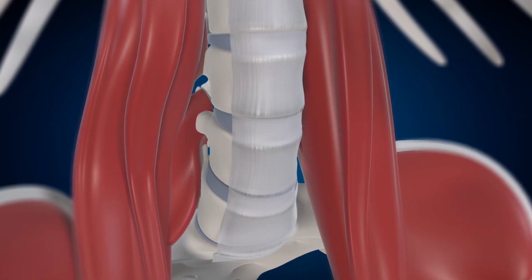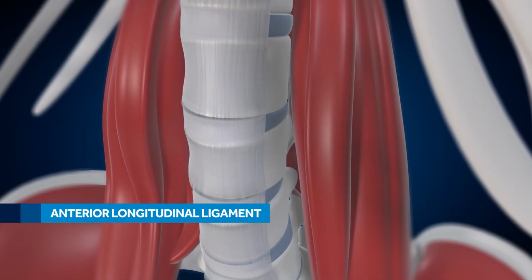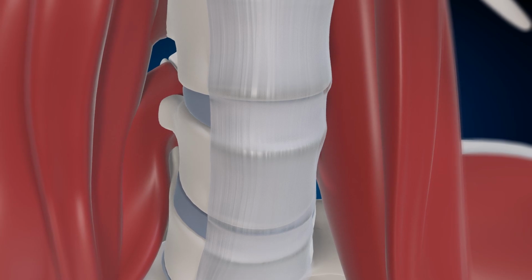The ALL is attached to each vertebral body inferiorly and superiorly at the end plates level. OLIF25 allows direct visualization of the ALL.